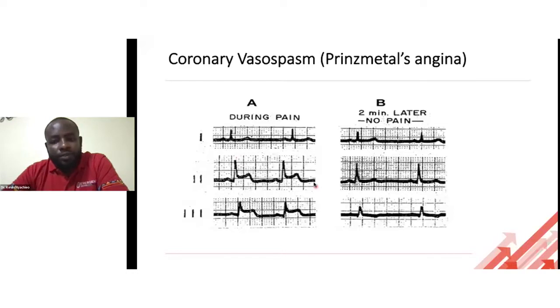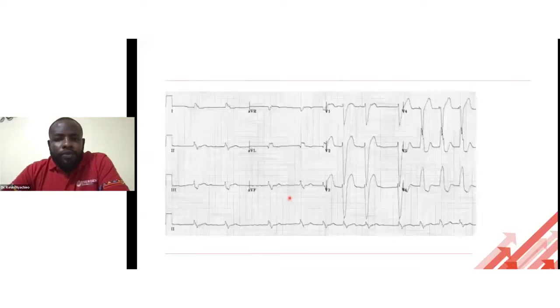Because it is impossible to differentiate these two conditions based on ECG alone, okay? But you might find that unlike in STEMI, the ECG changes here are usually transient, usually reversible with vasodilators. You give nitroglycerin, patient is fine. Okay. So Prinzmetal's angina, escalate. Let the seniors, let the cardiologists determine after angiography whether this was truly a STEMI. You don't want to make that decision that you decided for the patient this is angina. Send them home. Next one.